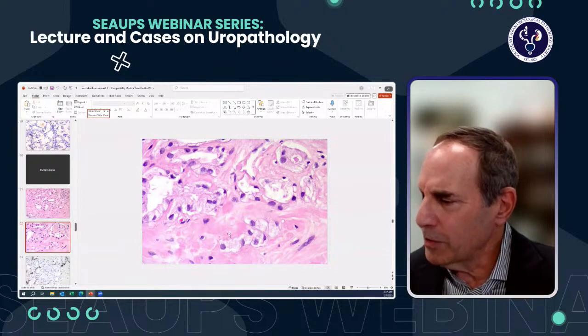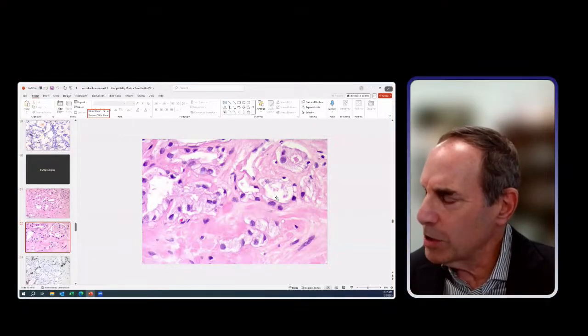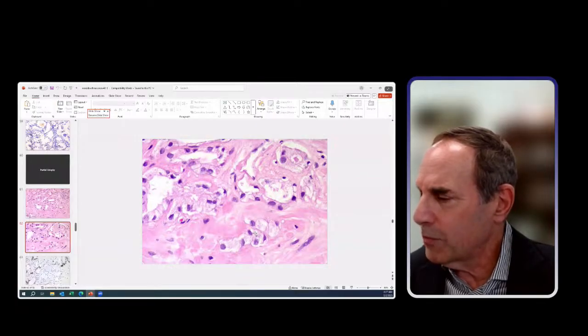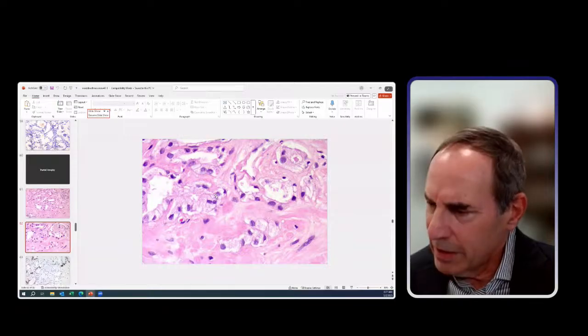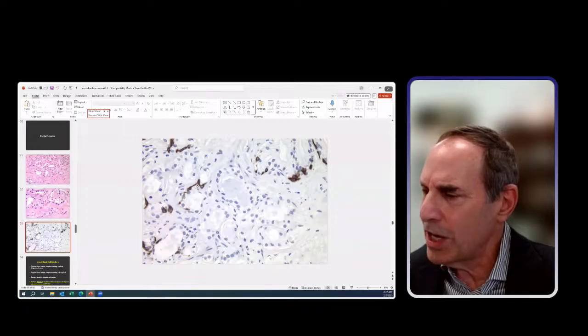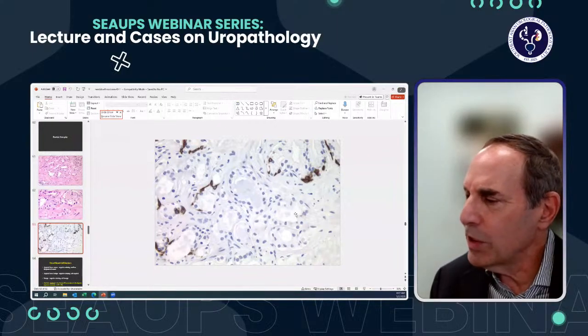Now, you have to also be careful both with partial atrophy and adenosis. Because you're dealing with a small glandular process, you can get tangential sections, even giving rise to what appear to be poorly formed glands or even cords of cells. But again, that's just an artifact of tangential section off these small glands. Now, similar with adenosis, partial atrophy has very patchy and focal basal cell staining. Again, within a given gland, you may only see 1 or 2 cells positive, and not every gland will show staining. So you can see a cluster of glands that will be negative for basal cells.